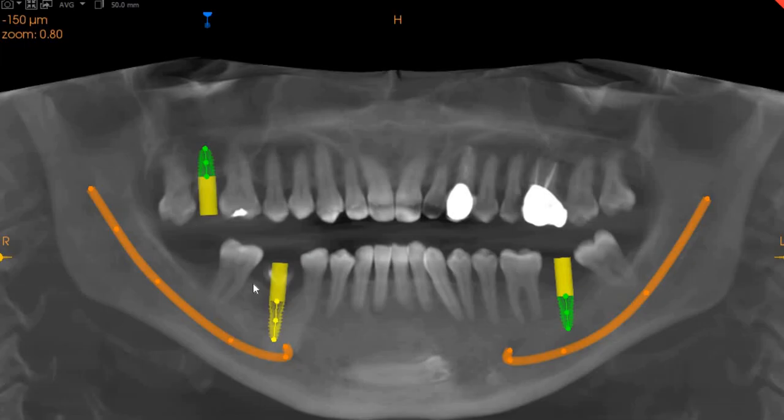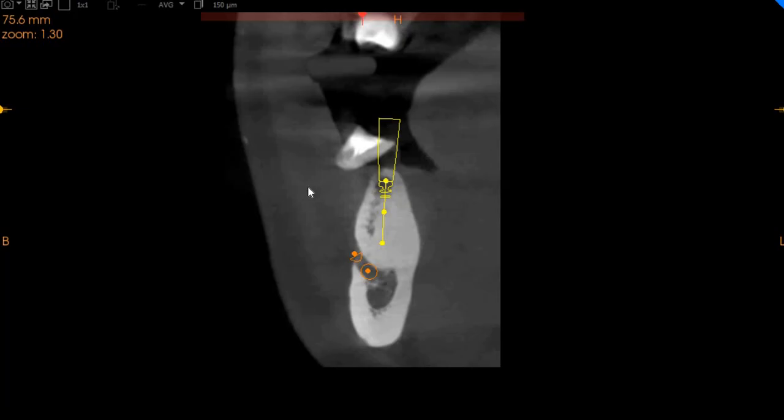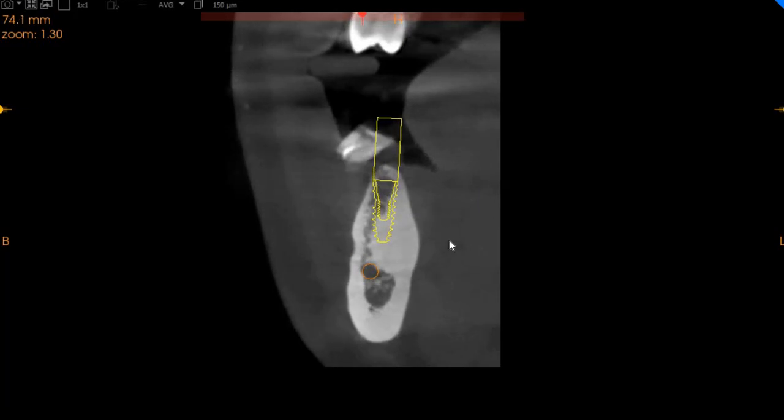Slight bit of apologies. I was considering the lower right anterior edentulous area as a premolar. My apologies. That's the lower right molar, and the area we showed you at the distal of the lower right segment, that's the lower right 8. So we've got the lower right 6 missing, and the lower right 6 unfortunately has a very thin ridge and also an osteosclerotic event going on here, as you can very clearly see. So this will need to be kept in mind because this can significantly hamper implant placement.